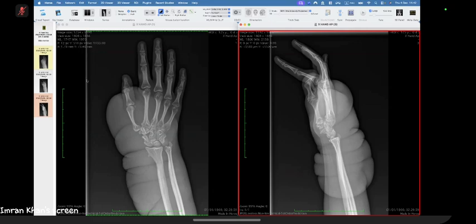Okay, let's just briefly discuss this before we move on. When you say lymphatic obstruction, would you think that the lymphatic obstruction would affect from the MCP up to the distal forearm and spare the fingers and the proximal forearm? Would that be something that would suggest it? I would expect lymphatic obstruction to cause gross swelling of the entire arm. Is that a fair enough comment? It's the entire arm. Okay. It's more the whole limb.